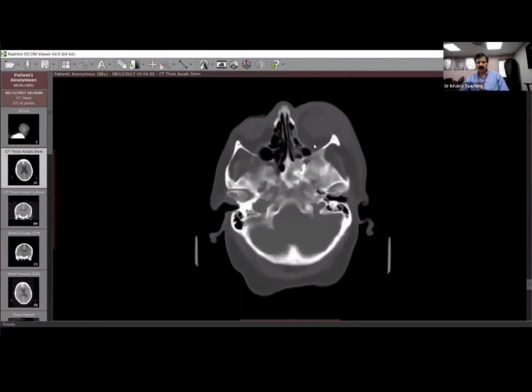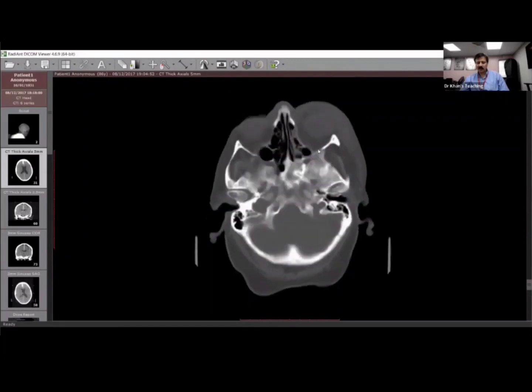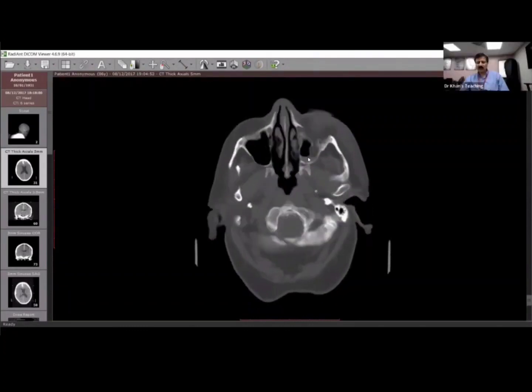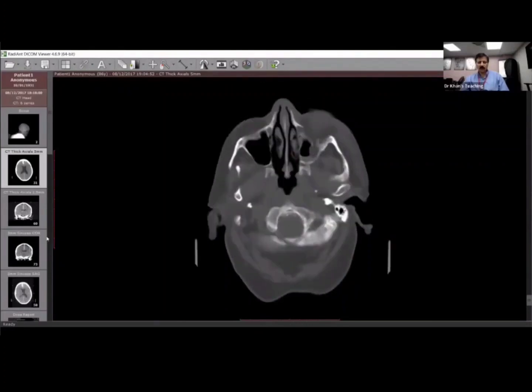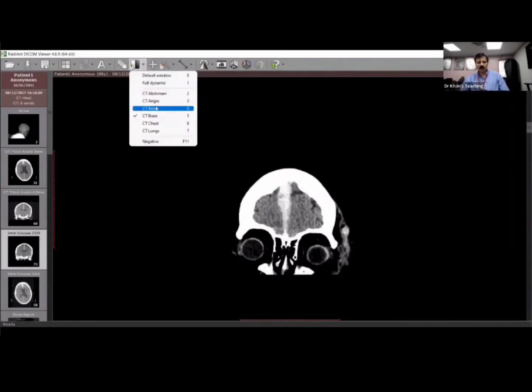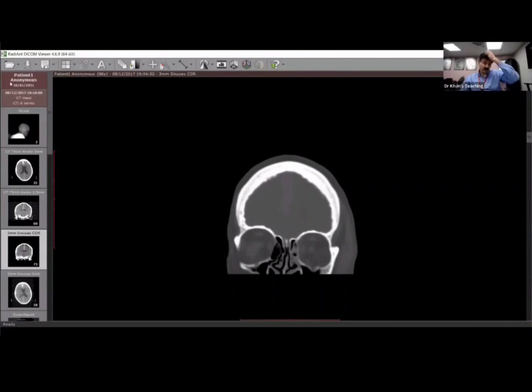this is the optic nerve, we are going inferiorly. Of course, nobody is expecting you to pick it up, but retrospectively speaking, something is extending into the maxillary sinus. You see this thing? Something is extending into the maxillary sinus. And then there is air fluid level. Immediately your mind should go, if there is something, as in a blowout fracture, and actually there was a blowout fracture, which you picked up ultimately, right? This thing here. So another case of satisfaction of search.